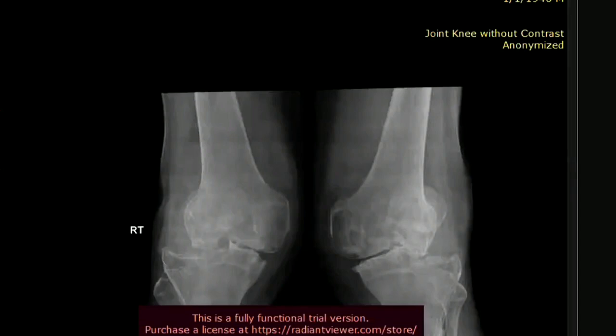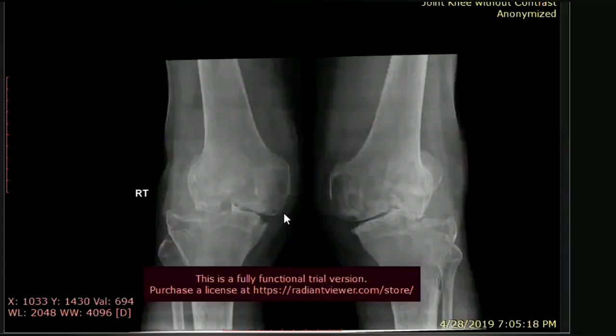There is mild bilateral soft tissue swelling around the knee joint, but no definite lytic lesion or destruction. In the rest of the bones I do not see any other fracture, and I do not see any calcifications along the soft tissues or within the visualized joint spaces. For the differentials, I would not be considering much of osteoarthritis because osteophytes are not seen here, but because there is bilateral involvement, RA can be one possibility. Advanced osteoarthritis versus RA is what I would be thinking of.